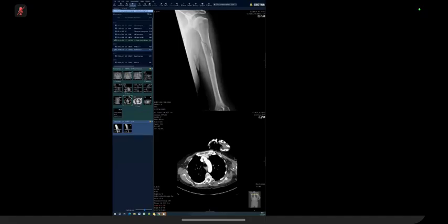So describe the fracture, always say displaced, not displaced, stable, unstable, if that applies. It doesn't really apply here much, but you can say that there are cortical breaches on both sides. And you rightfully said there is a lytic lesion. Straight away you said the bone is normal, and then you said it's abnormal. Like I said, always with the fracture in a Viva, there's something wrong about the fracture. It's not a simple fracture.